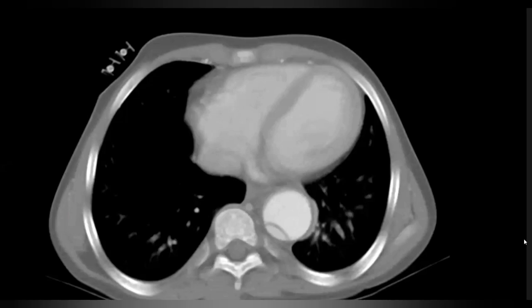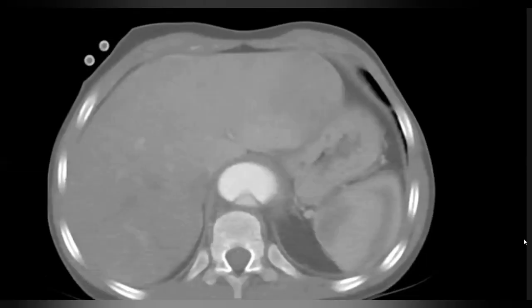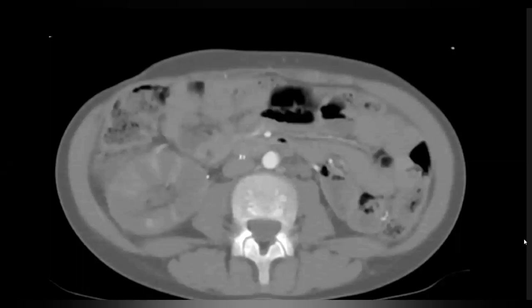So what is your answer? So this is a descending aortic dissection, Stanford type B, with no evidence of rupture. Excellent. What's the management of these generally? So it's treated conservatively. There is no surgical emergency in this unless it is ruptured. Or if the patient has become hypotensive, or there is vessel compromise, because the false lumen impedes flow to the visceral vessels.